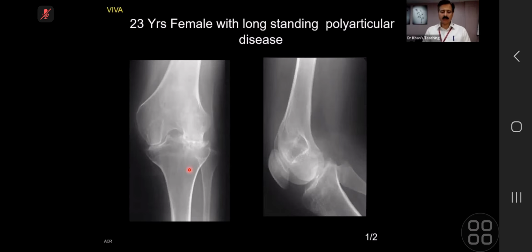Please remember, I'm showing it to you for a particular purpose. This is a classical, very favorite film where they will show you some young patient, particularly on knees. And this also is what we call a story film. Story films are extremely important for your 2B exam. A story film is a film which tells you a story, simple as that.